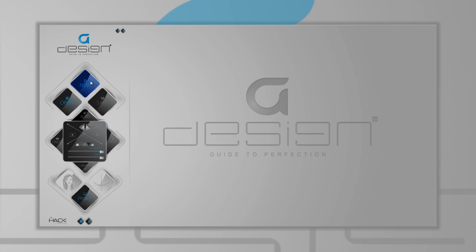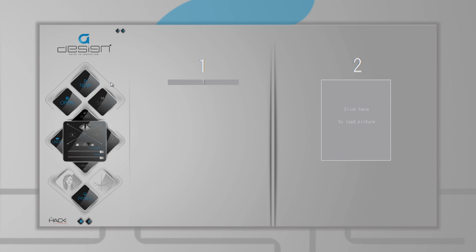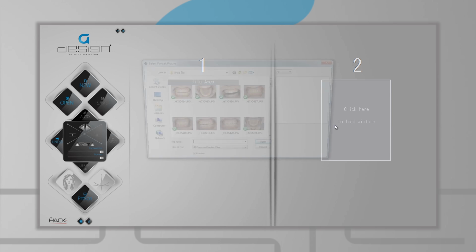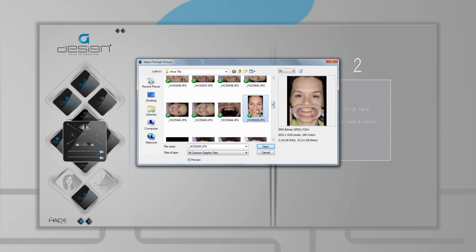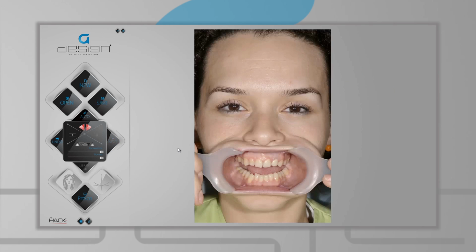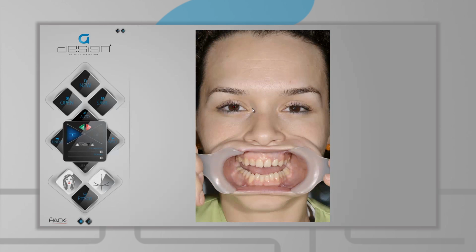Press New to start a new project. Box 1 should contain the patient's name. In Box 2, please load the patient's portrait photo. Press Auto for automatic detection of the pupils. The two symmetrical points that mark the pupils can be set manually if the user prefers to do so.